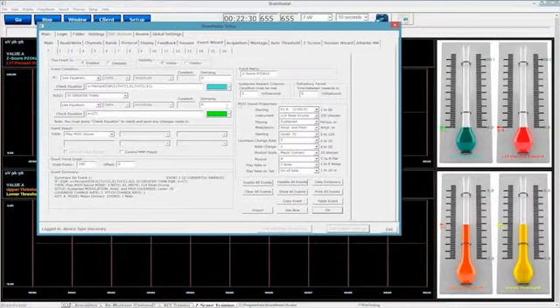Then the final thing that I'm going to cover over here in the Event Wizard is our MIDI sound properties. Now, for those of you who use this, this gives you a little bit more control over the reward sound if you use Play MIDI Sound. You can choose the starting note, the instrument, the type of playing, modulation, starting loudness rate, loudness change rate if you're doing amplitude, note change rate if you're doing pitch, and what type of musical scale you're doing. A lot of different great features on it.